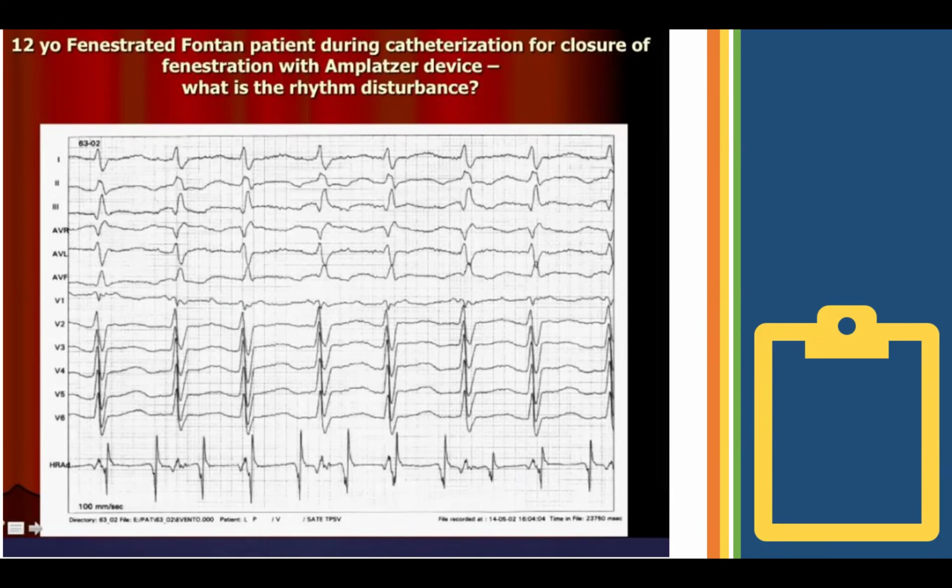It's also clearly not complete heart block, right? When you see more P waves than QRSs, one often will think that you're in complete heart block, but the fact that there is a variability of the R to R interval is often a very good clue that there is at least some conduction and that there is not complete heart block. So by definition, this had to be at least second degree block, but not third. And so this is a patient who has Wenckebach.